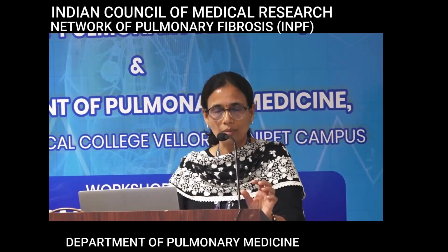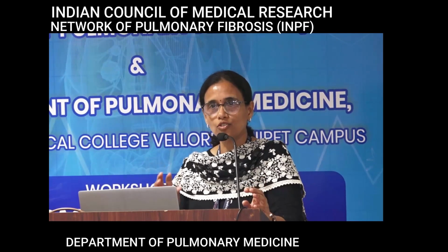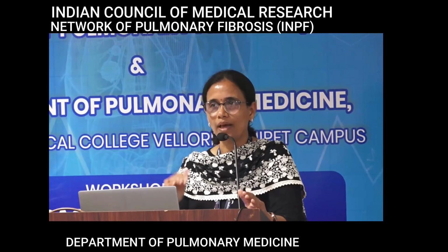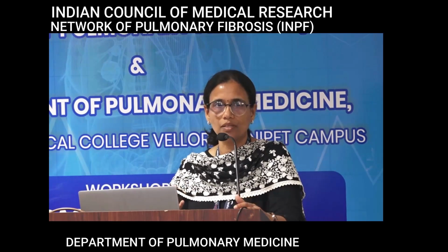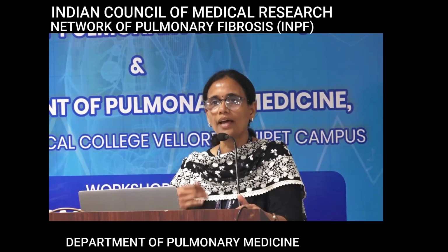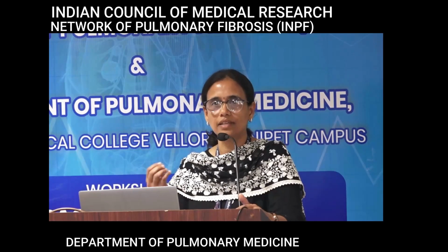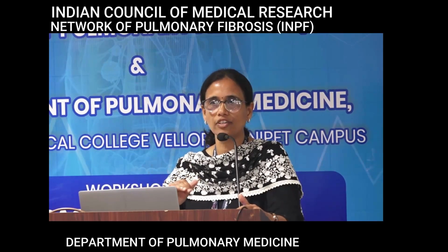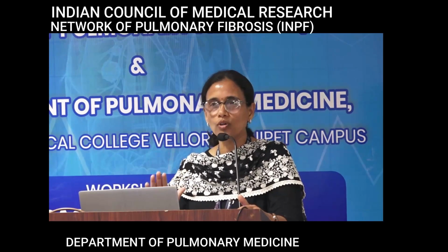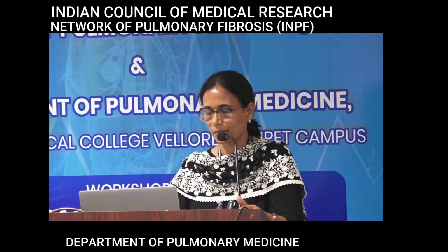But I just want to stress one point. For hypersensitivity pneumonitis, we need to show that there is parenchymal involvement as well as airway involvement. Parenchymal involvement we will show by the mosaic attenuation or the ground glass densities that we need to see. And the airway involvement we will demonstrate based on the centrilobular ground glass density nodules that we saw, or the air trapping. So we need to have both to make the diagnosis of hypersensitivity pneumonitis.